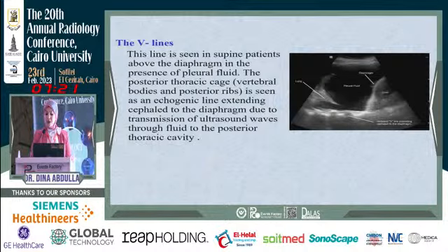Female, 2.5 years, blunt trauma to the chest one week ago. Here we can see that there is a right hemothoracic veiling, patchy consolidation in the upper and mid zone with reduced volume. We can see a right-sided chest tube, misplaced or displaced, with subpleural consolidation and right-sided hemothorax. And within the consolidation, there are cavitary changes, early cavitary changes.